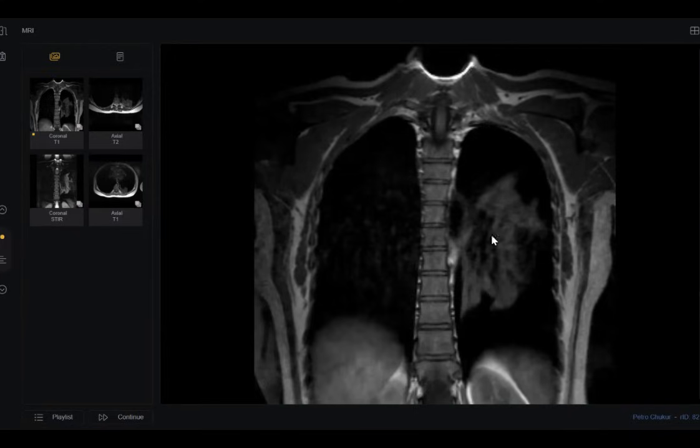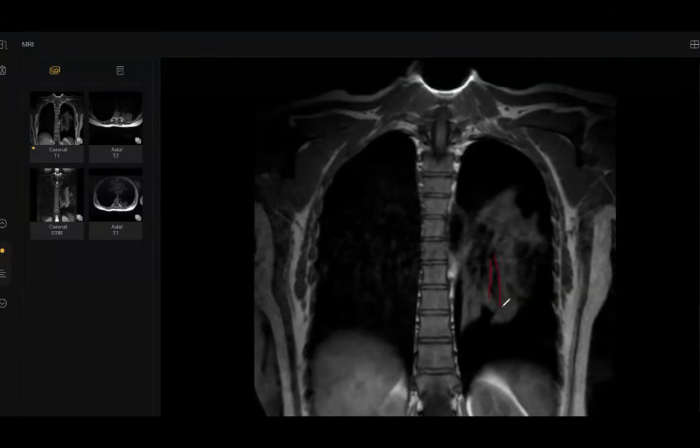This is not a lesion. Why? This is the bronchi, the dark tubes. This one are bronchi. So talk about collapsed lung, totally collapsed towards the center, and there is no vascularity peripherally. So I suggest it is pneumothorax in MRI.